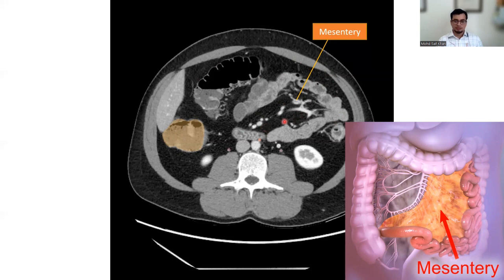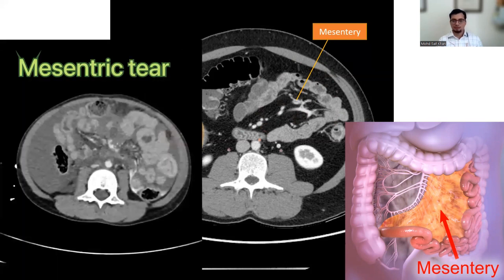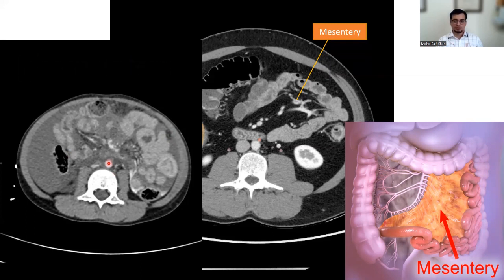A mesenteric tear may occur with lap belt injuries, which can give rise to hematoma and hemoperitoneum. In CT, you would be able to appreciate a high density blush within the mesenteric root, and contrast pooling down in the left posterior abdomen.